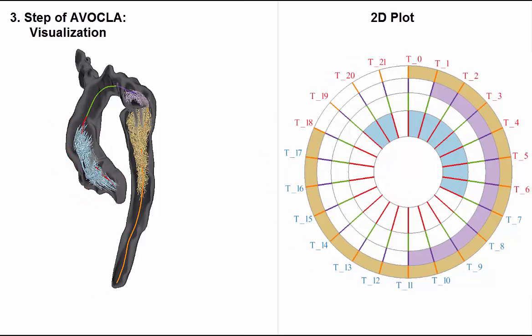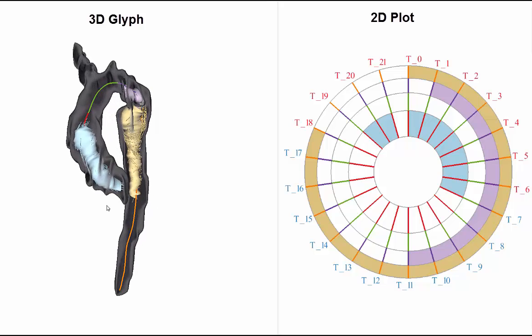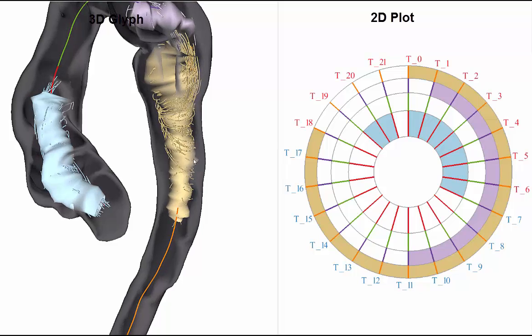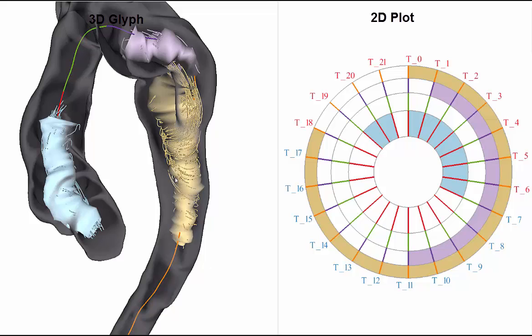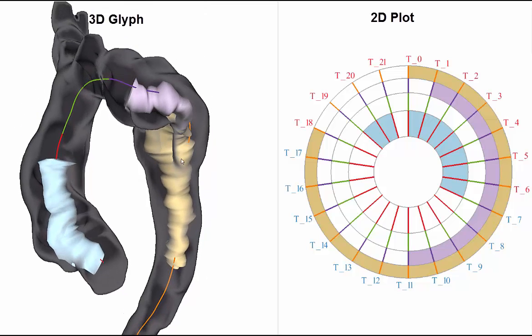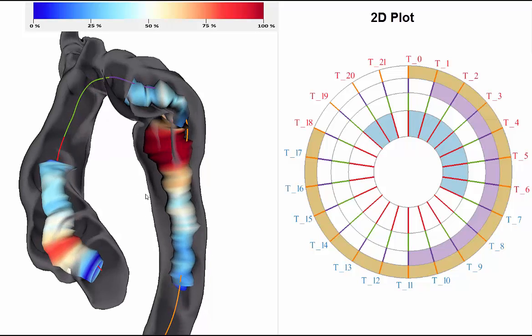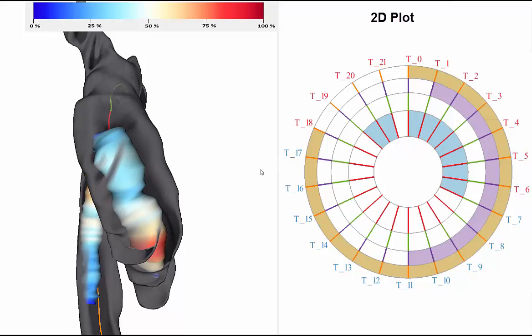The 3D glyph-based depiction shows the radial expansion and rotation direction of the vortex. Therefore, we determined the surface that envelops the vortex, whereupon both properties are mapped. The radial expansion is visualized using a linear color scale. Areas that occupy less than 50% of the vessel diameter are mapped on the blue gradient, and otherwise on the red gradient.